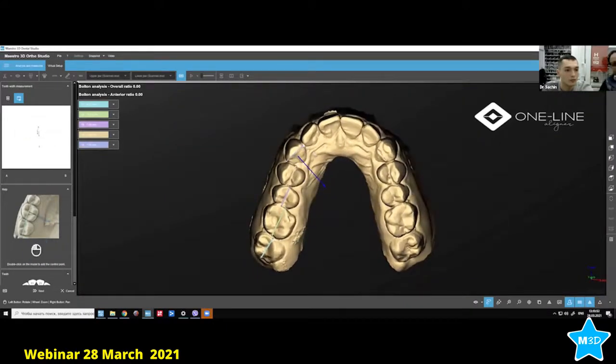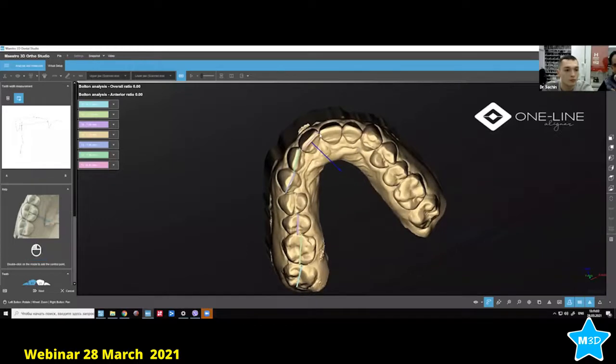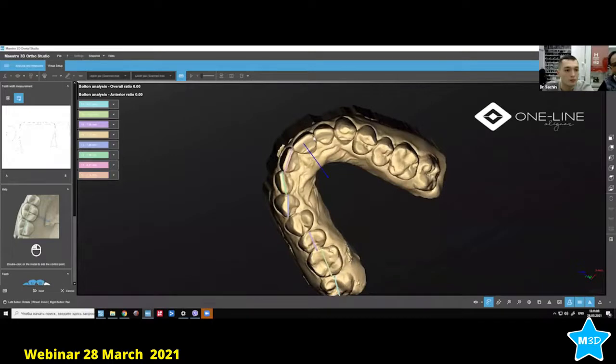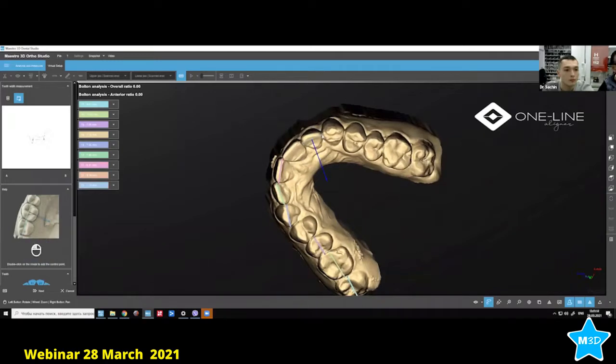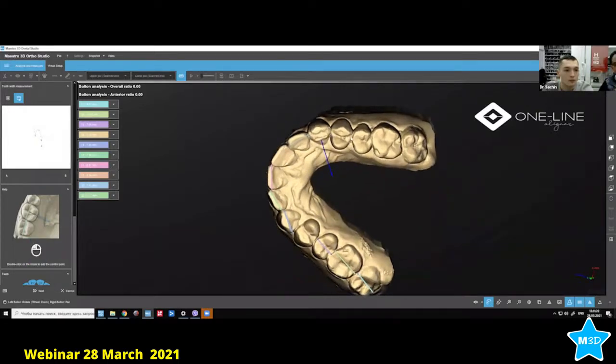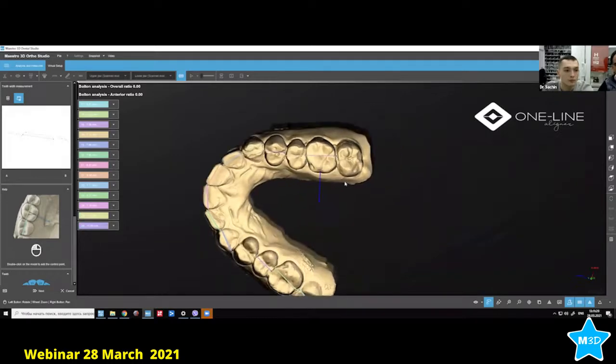I hope this part will also be very interesting for the doctors or technicians who are new to the software. You can actually see somebody who is doing around 20 to 25 segmentations a day, so he's pretty used to it. He can show you some of the points which might not be clear when you're doing segmentation, especially in cases which have spaces. In those spaces, it's difficult to do segmentation with Maestro. Maybe I don't know about the other programs, but with Maestro it becomes a little difficult. So we'll just see how it goes today with this segmentation.